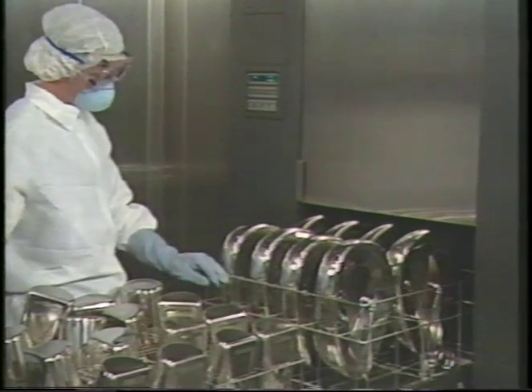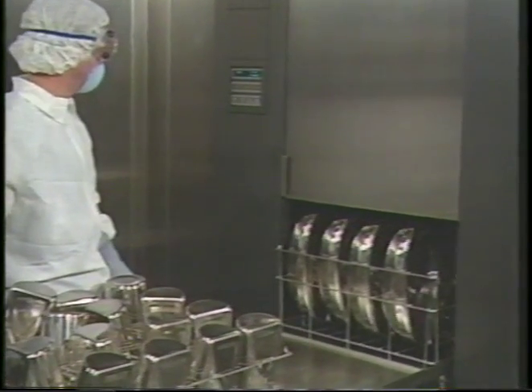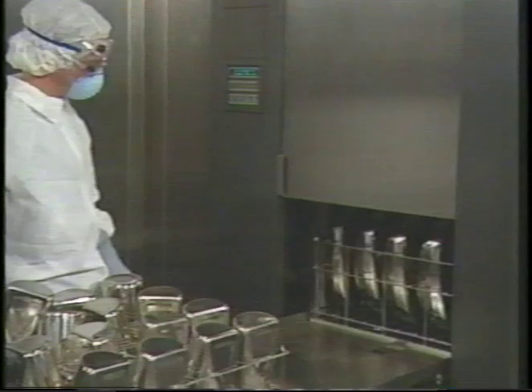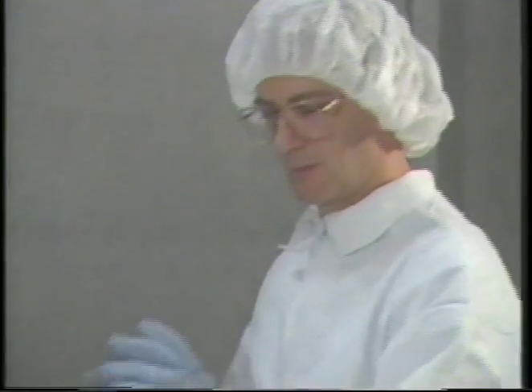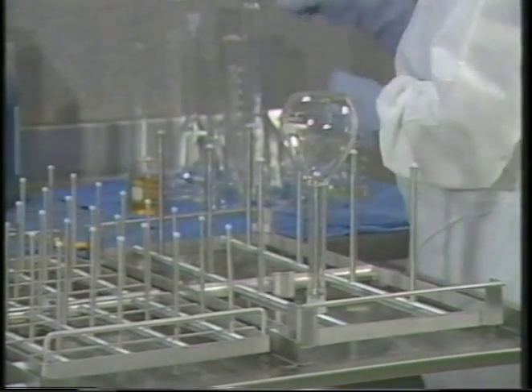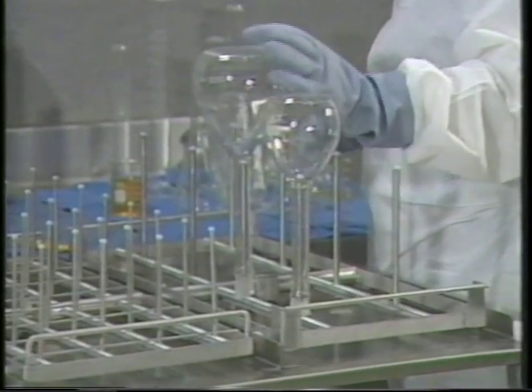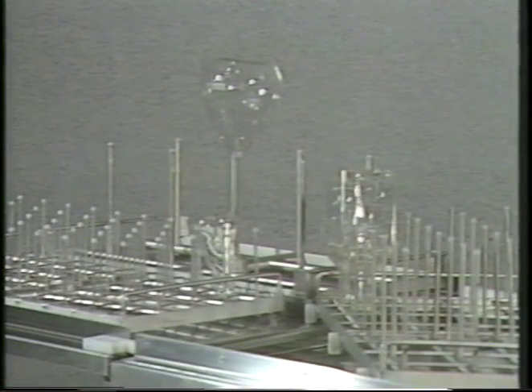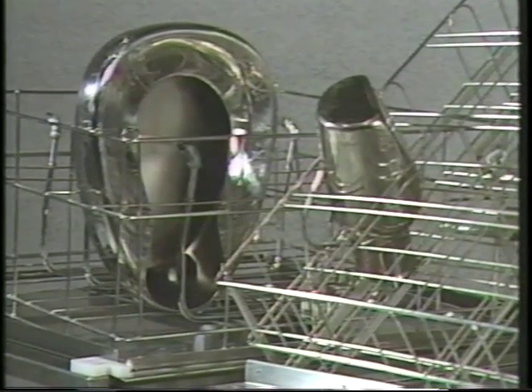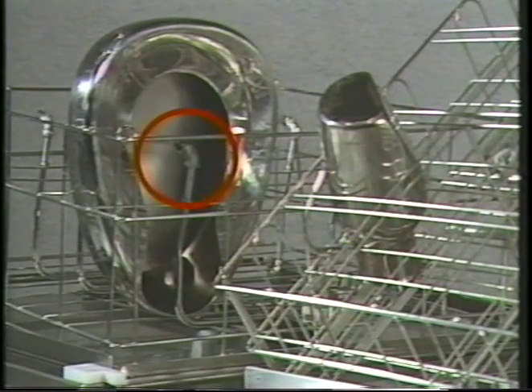When using a mechanical washer, the fundamental rule in loading is to arrange the devices in such a manner as to allow for appropriate coverage of water from the spray arms. All devices such as flasks, beakers, test tubes, and graduated cylinders should be used with the appropriate accessories. Using the proper accessory is essential to cleaning efficacy. Specialized accessories are available for different types of glassware, utensils, cages and racks, and instrumentation. Manifold systems with individual spray jet spindles assure thorough internal cleaning.